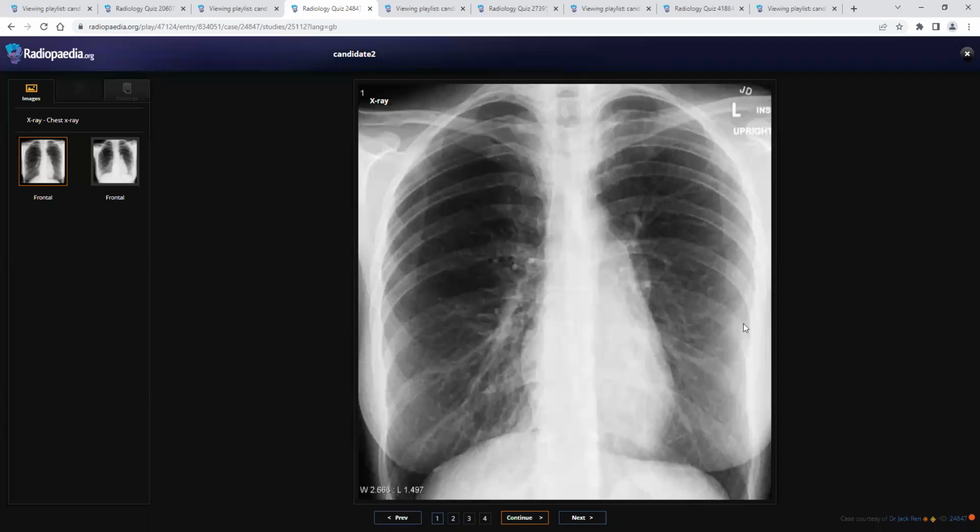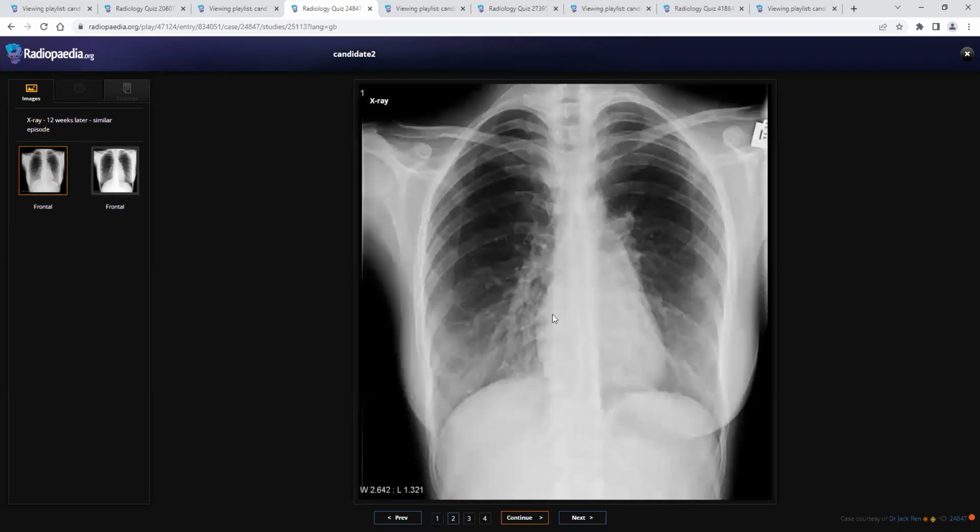I don't know. Okay, yeah, this is a very small pneumothorax and it is not causing any mediastinal shift or much symptoms, or loss of saturation. That's why we followed it up with a series of X-rays. And the lady again presented 12 weeks later with this chest X-ray. So what do you see?